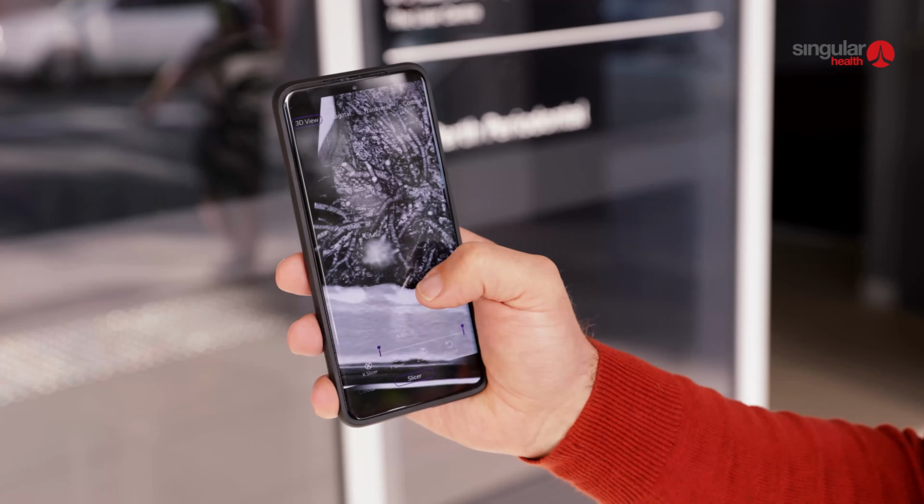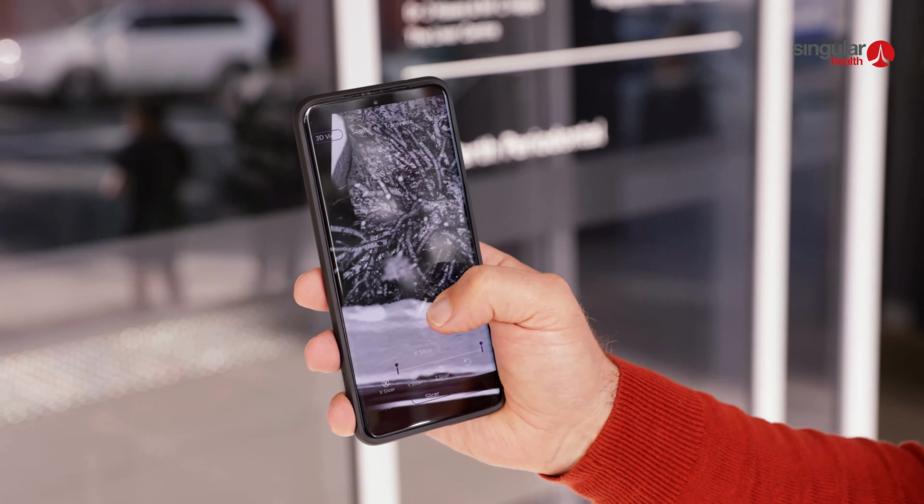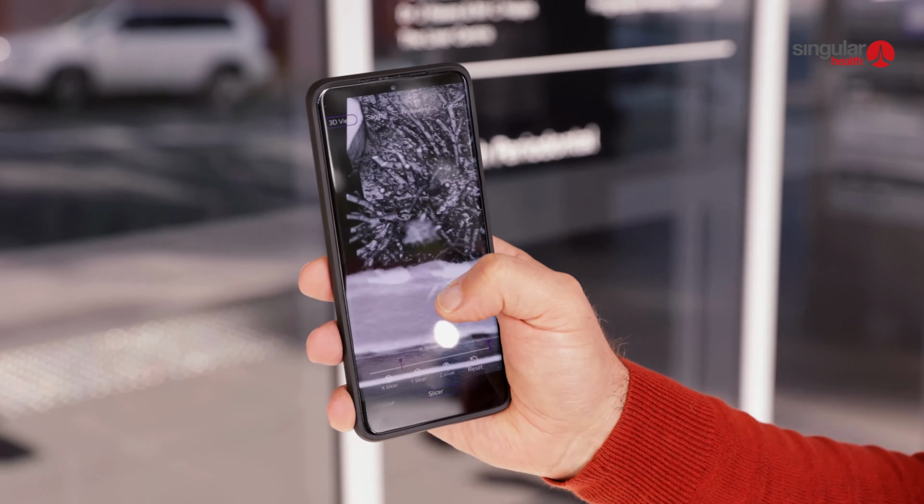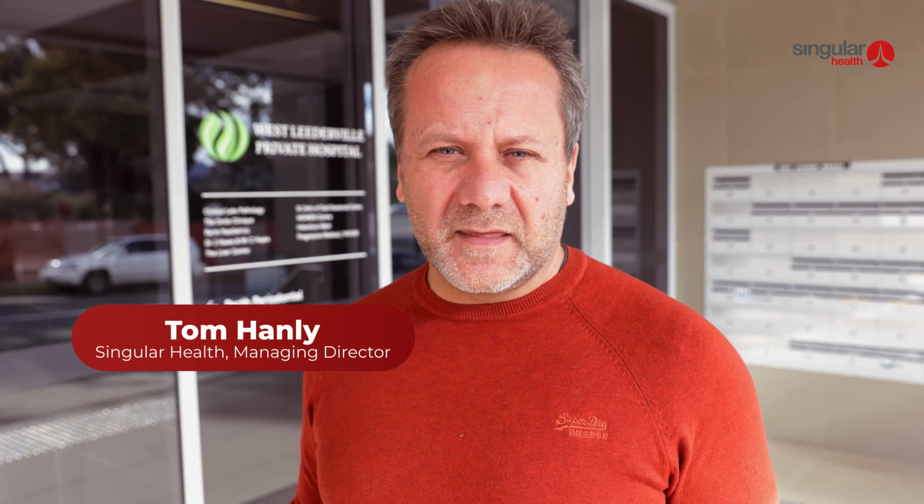After a 10-minute consultation, the simple and easy way of transferring 3D CT scans from your clinician's computer to your phone has been demonstrated. Within the clinician's workflow, he's been able to demonstrate to me the CT scan in 3D and transfer that to my mobile phone for me to show my family at home.